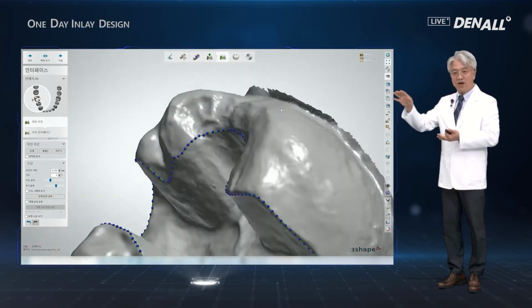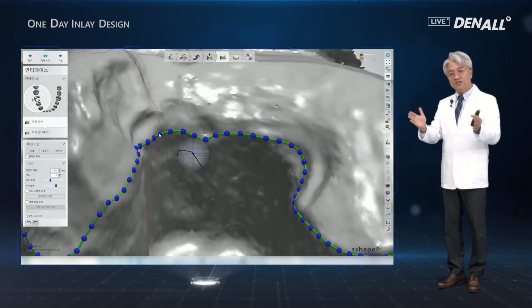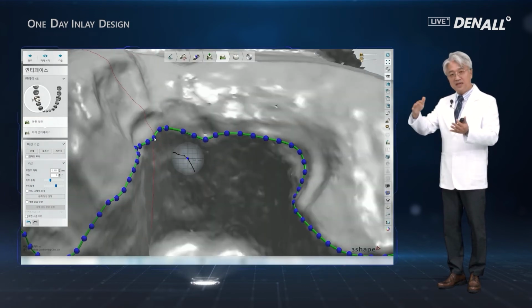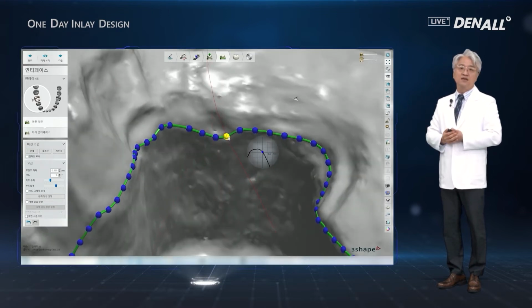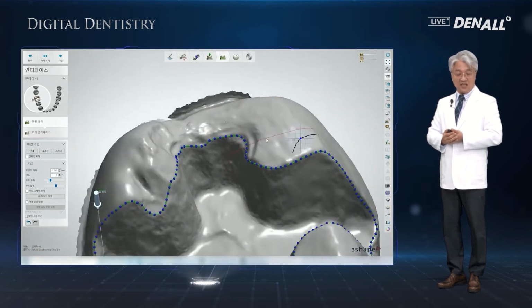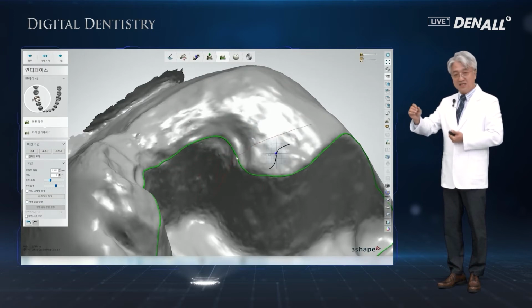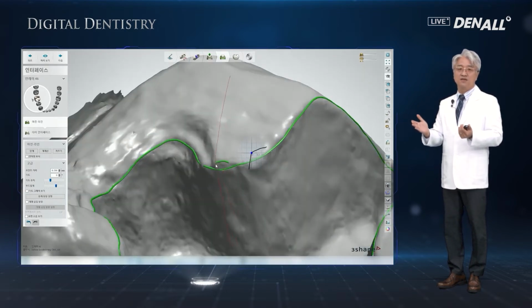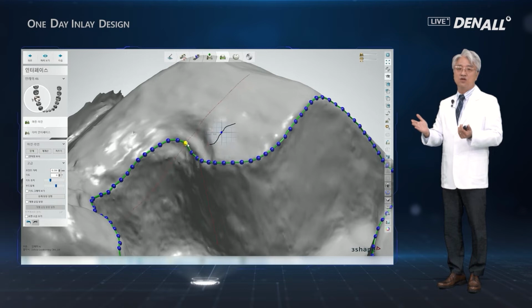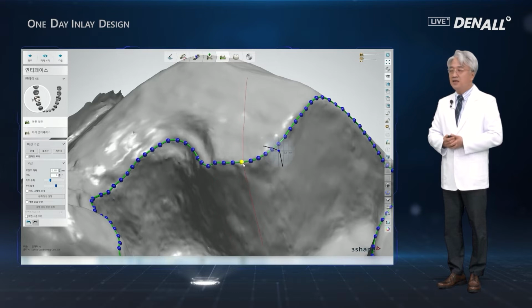But with the margin setting, with this enlarged image, it means that the CAD system can now distinguish up to this very detailed level. It has become that precise and accurate. So the inlays that are made with the CAD system are very precise. It really clinically has very good results. So it has become a very dependable solution.